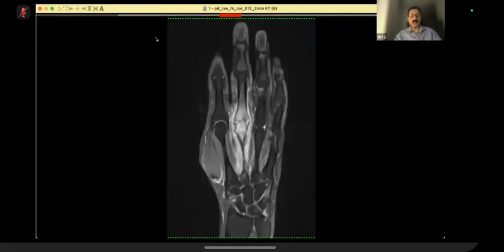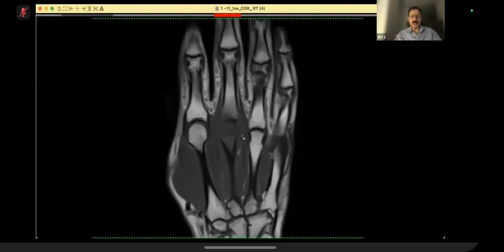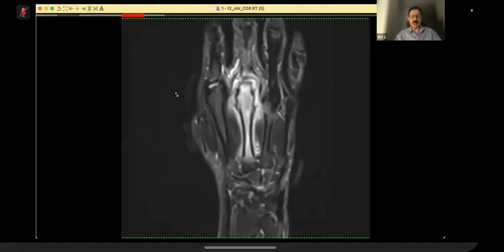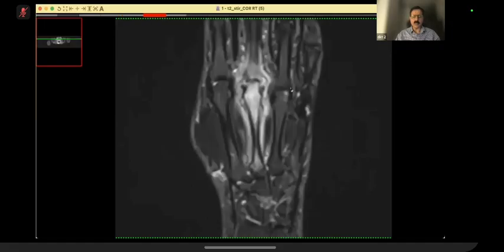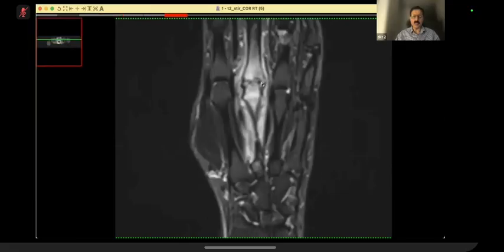On this T1 weighted sequence, you can see marrow edema, which is low signal, and you know this is all abnormal. On a stir sequence, we can see that there is a lot of edema. You did very well where you asked for post contrast, which is not uploaded here, but we did post contrast also. You were absolutely right. This thing here is in the joint space, and this did not enhance on the post contrast. So this was septic arthritis with, of course, osteomyelitis.